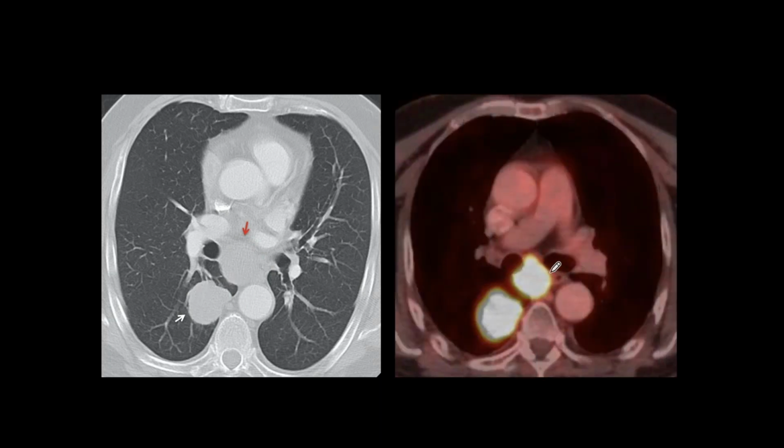Well, this patient was examined with the CT, of course. It doesn't tell us anything new because it shows the lymph nodes in the subcarinal area, which we already knew, and the mass in the lung, which we also have seen in the lateral view. PET-CT shows a marked uptake in both areas, and of course, the final diagnosis was a carcinoma with metastasis to the subcarinal area.